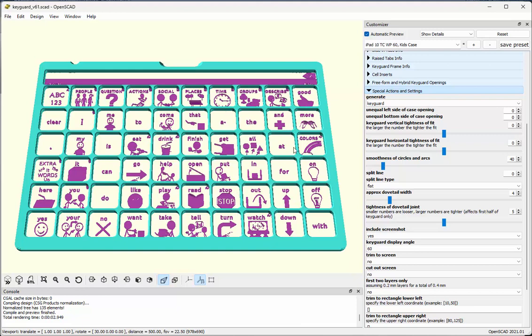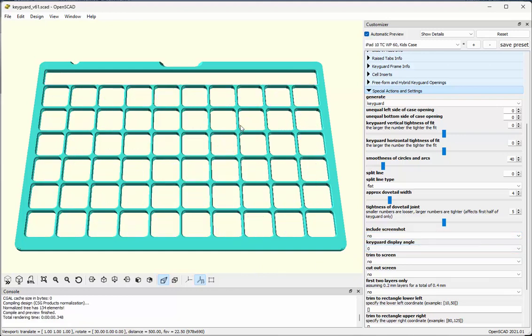If I didn't, I might consider reducing the height of these rails so that I could see more of the graphics, more of these bars up here. I'm also going to change that number back to 0 again, so I have more freedom in rotating the image around. For now, I think I'm also going to hide the screenshot, or not include the screenshot, just because including it adds extra time to rendering the display.